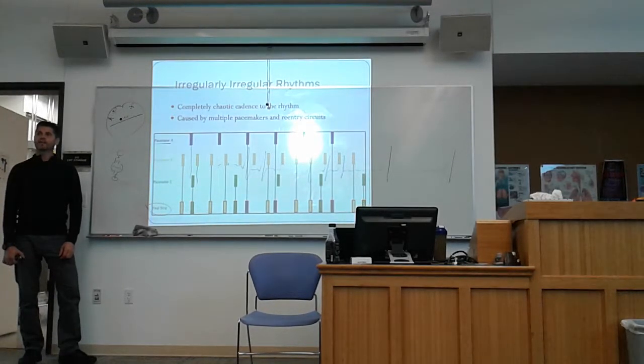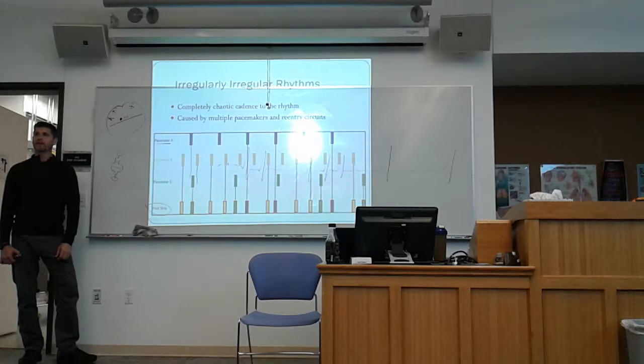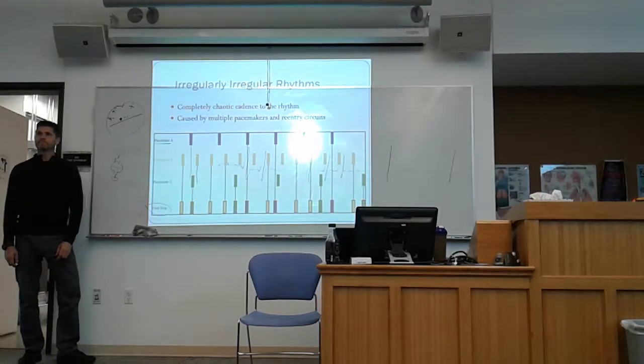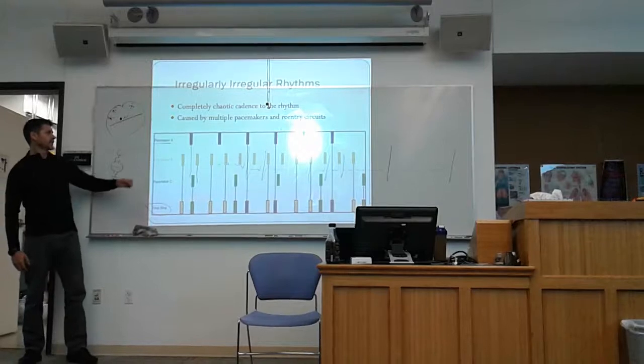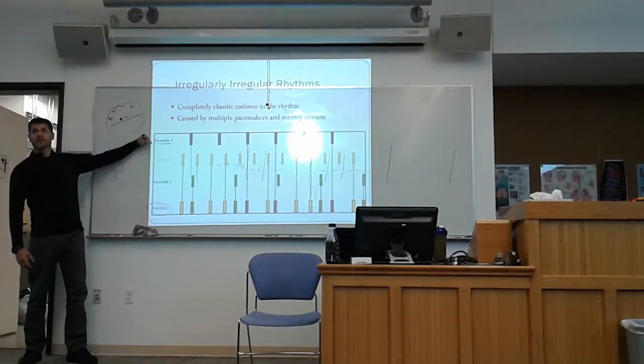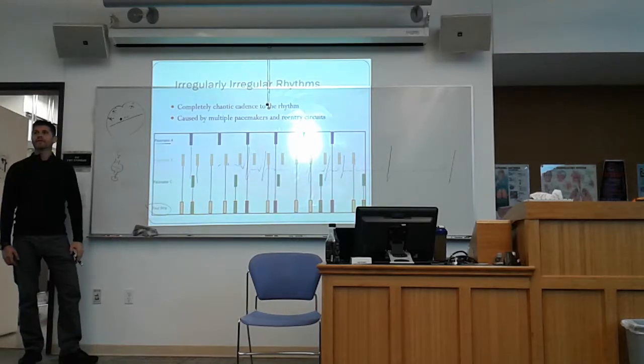We have not discussed, we've not gotten past determining the regularity of the rhythm yet. We have to get a little further to identify exactly where it's coming from. But we will be able to identify, yes, you will be able to identify if this is a single pacemaker that is coming irregularly for some reason, or it's multiple pacemakers that are causing grief to the AV.